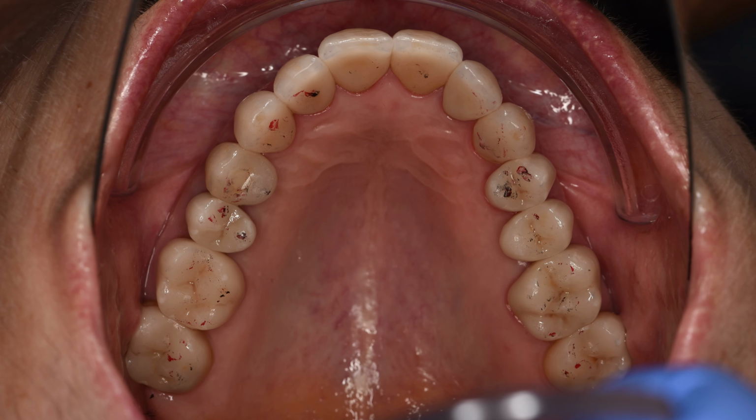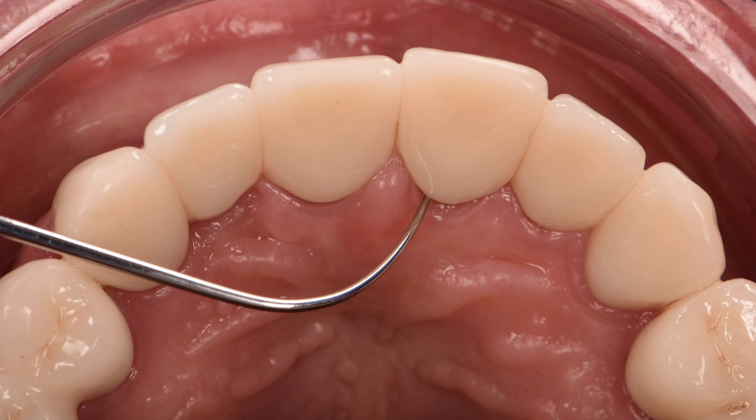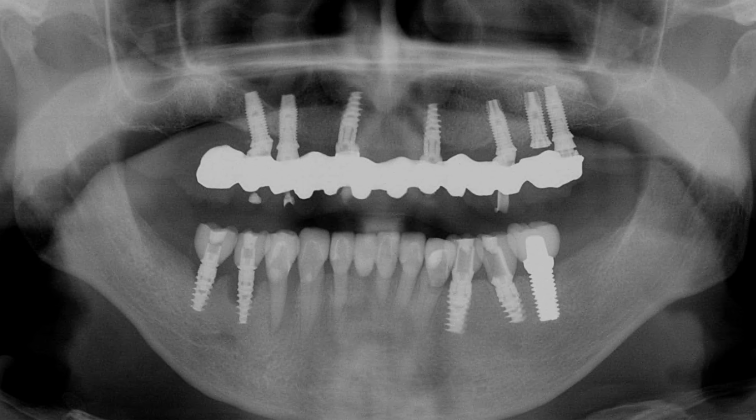Back in the days when I was still working analog, my approach to treatment planning was already systematic, but the results were sometimes varying and every once in a while also deviating from what I expected. And that was bothering me a lot. So when a patient visited our practice, we would decide on a course of treatment and then we embarked on that path. However, the journey would often lead to unexpected challenges and problems that would later require additional try-ins, registrations, adjustments, and in a worst-case scenario, a redo of the prosthetic work. That means I couldn't see, diagnose and execute properly.